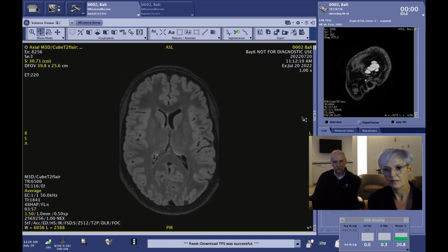definitely improves with this software level of MR30. So that's what we wanted to share with you, just a brief introduction here of some of the new features on MR30 and the expansion of Recon DL into this. So Recon DL expansion is going to be available across the entire portfolio of our 1.5T and 3T products.